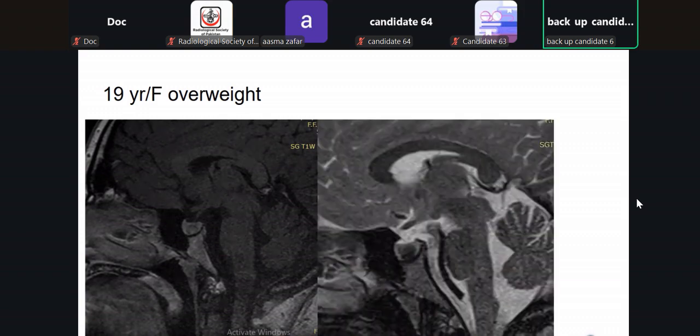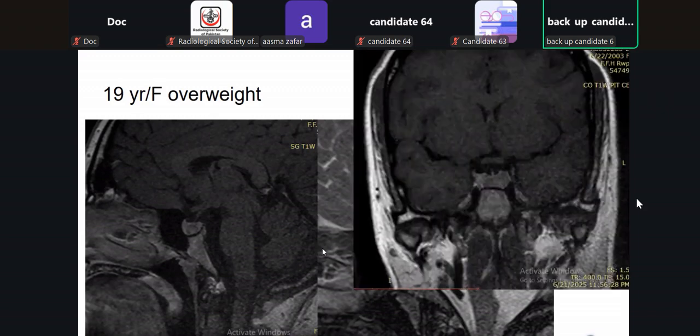Yes, madam. This is the spot image of a T1 weighted sagittal MRI brain, where the brain parenchyma appears normal. The most striking abnormality that I can appreciate there is the enlargement of the pituitary gland, and a small relatively hypointense nodule is noted within the pituitary gland.